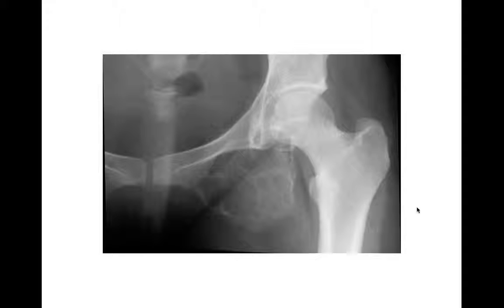Could this be a plasmacytoma or multiple myeloma? Absolutely. In an older adult, I think you need to consider that. Brown tumors can occasionally look like this. Those are other things to consider in your differential. This case turned out to be an aneurysmal bone cyst. I think here you're kind of stuck with a differential and have to use some history and age to help guide you. This was an aneurysmal bone cyst.